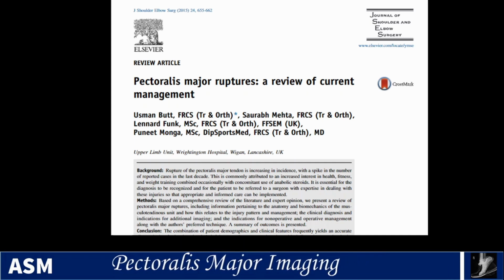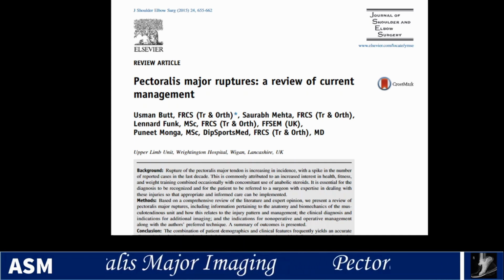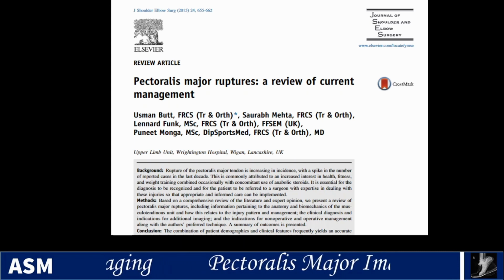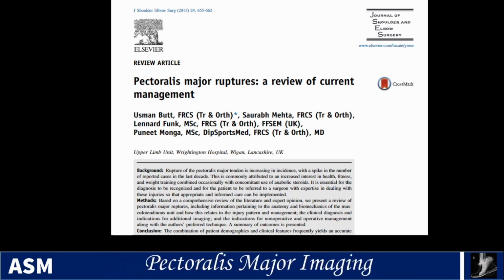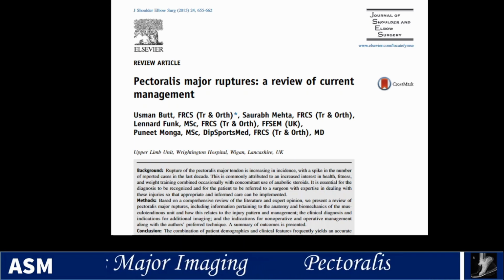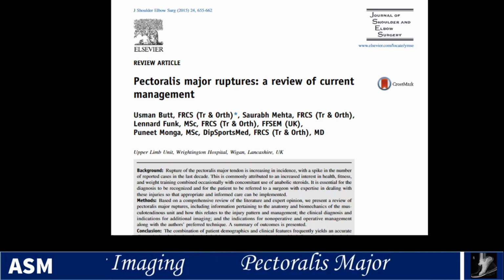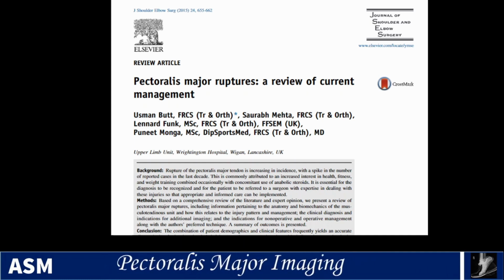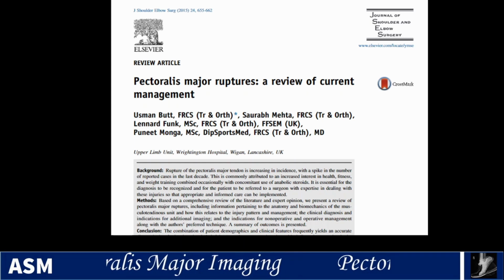You can have a tendon tear in between the attachment and the myotendinous junction. You can have a tear in the myotendinous junction. And so these areas may be more likely to have surgical intervention in the appropriate clinical setting. Injuries more medial in the muscle and at the medial attachments are less likely to have surgical intervention for those. So you want to take into account the clinical factors.